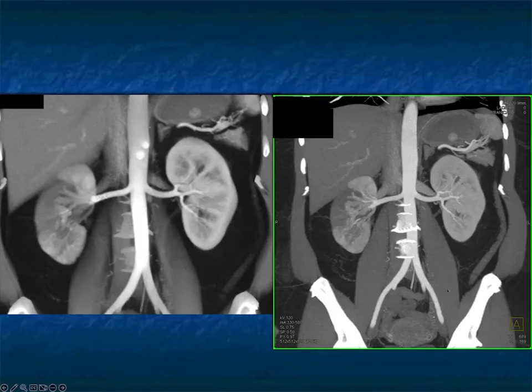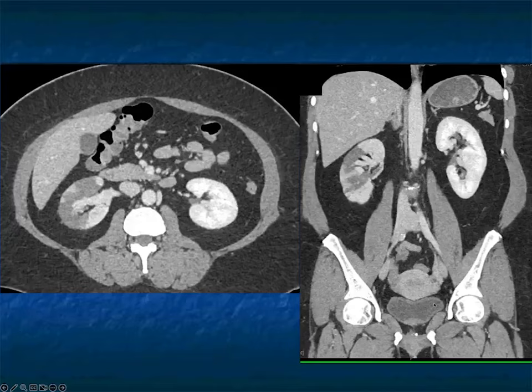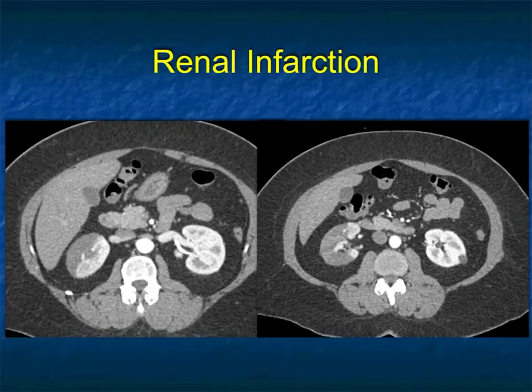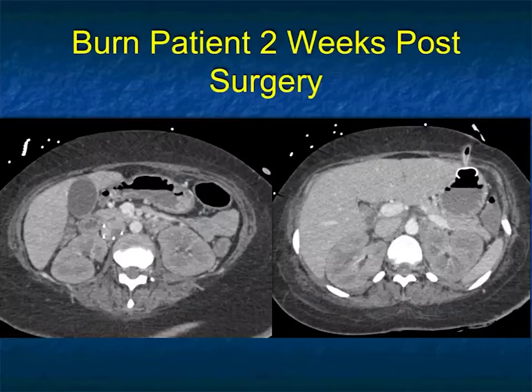And if you start looking hard at the patient's renal arteries, the main renal artery, you lose the branching here. There's amputation of the vessels. That's classic for a vascular process. You could even potentially think about a vasculitis. Here it is a little bit later, the wedge-shaped defects, and this was a renal infarct due to vasculitis. Really nice case.